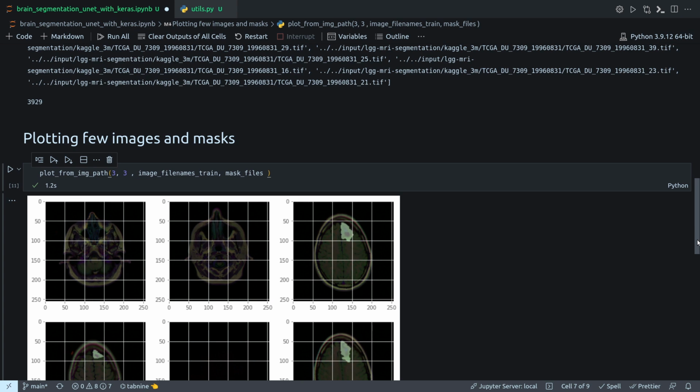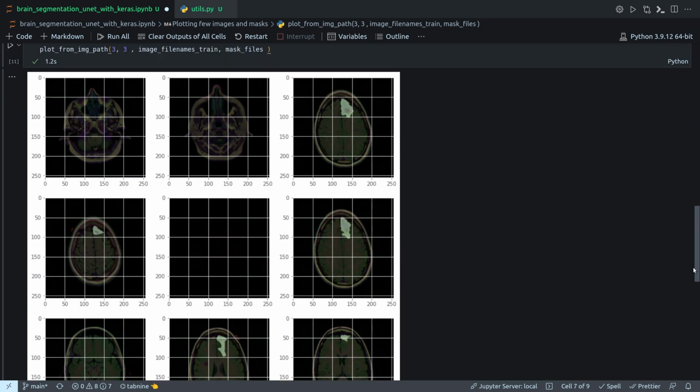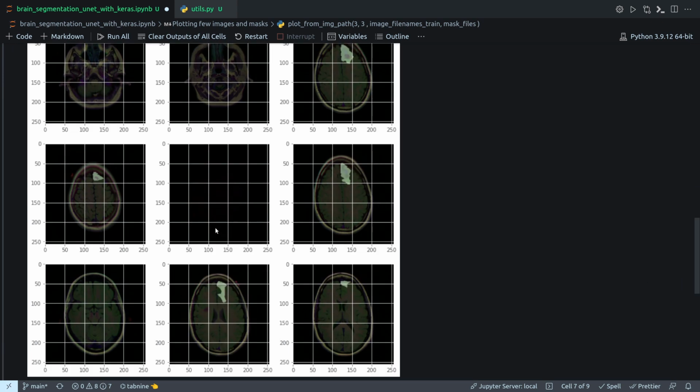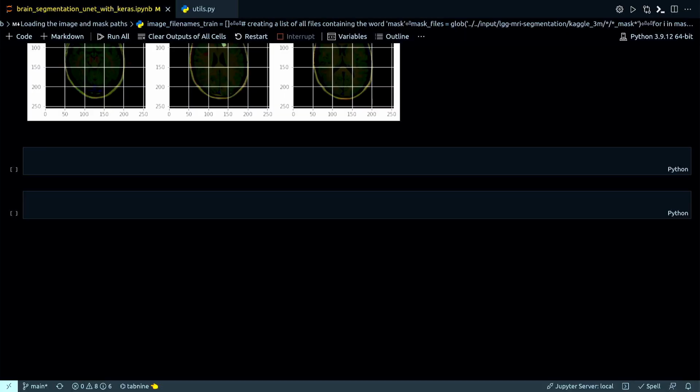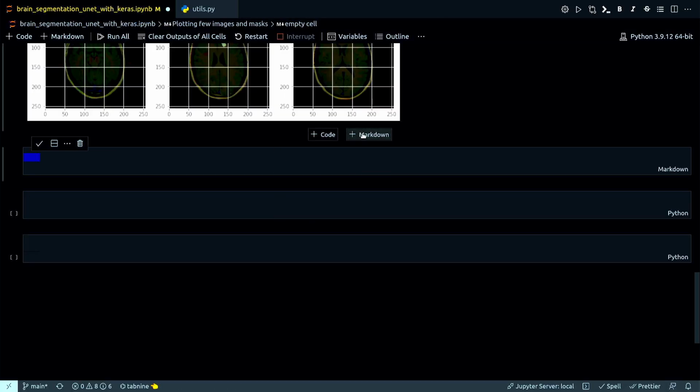Awesome. So these are the images from the dataset. It has randomly printed some actual images and some masks. So I think this should be the mask one. And now I'm going to create a data frame from my train set, validation set, and test set.